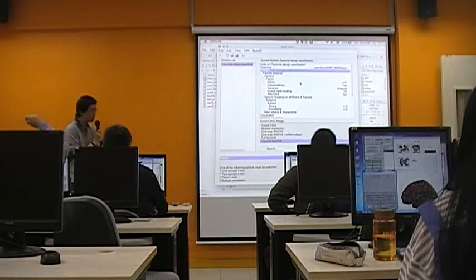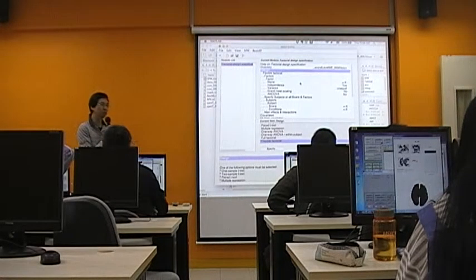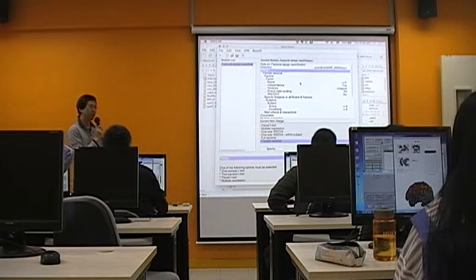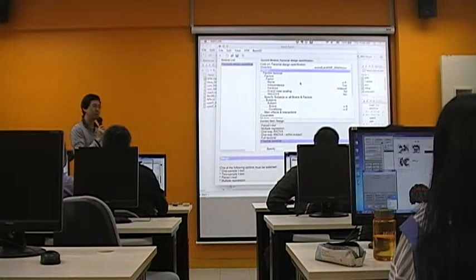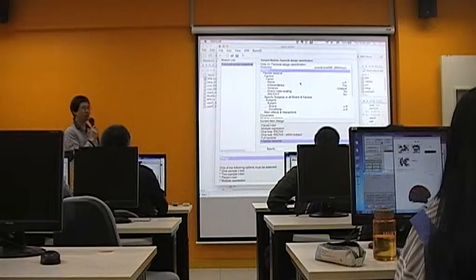The gist of using a flexible factorial design, as compared to a one sample t-test or two sample t-test, is that you keep using the original beta images instead of defining a contrast in the first level and bringing it to the second level.